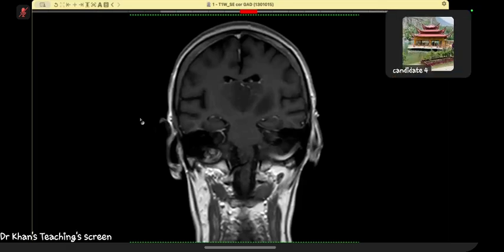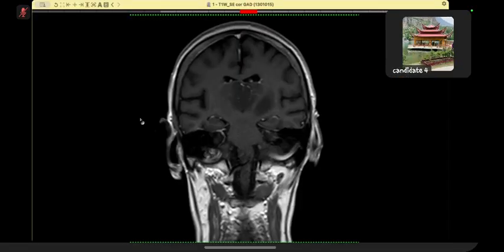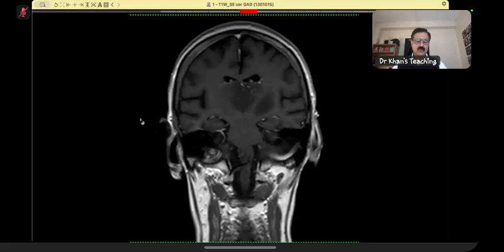What else? Sir, apart from that, it is less likely to be a deep cerebral sinus thrombosis, as I can see no gross filling defect in the visualized sinuses, and the deep cerebral veins appear to be patent. You have seen whatever you wanted to see, and there is nothing else for me to show you. Just give me the final diagnosis. Sir, bilateral thalamus involvement can be in the artery of Percheron thrombosis as well, because it is restricting, acute infarction. No, the ADC was not there.